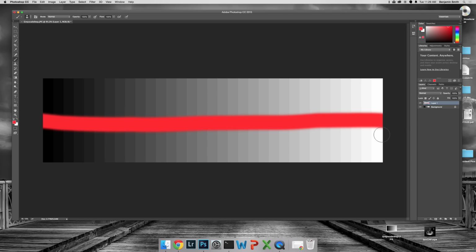And as you see, it did what it said it was going to do. It put a swath of red paint right over top of my ultrasound image. But we can't really see the ultrasound image beneath it, so you can actually go over here to select opacity and drop that down. So we're starting to get the idea here that you can paint over top of an ultrasound image and actually see the ultrasound underneath. So this is actually starting to become useful. But if you play this ultrasound image, you're just going to end up with this swath of color right over top of your image, and you're not going to get a sense of motion whatsoever. So it's not going to really be exactly what you want.